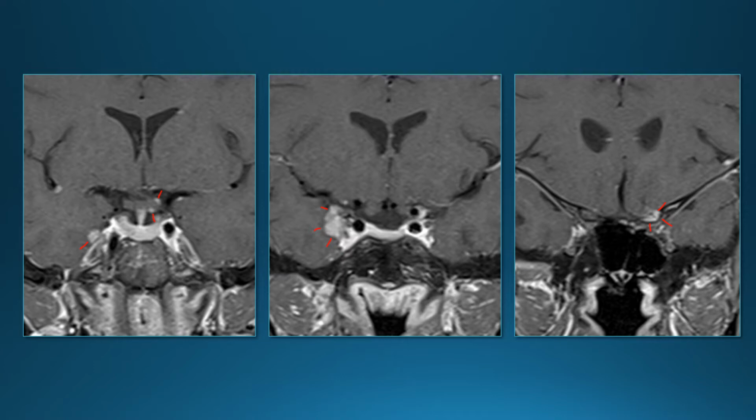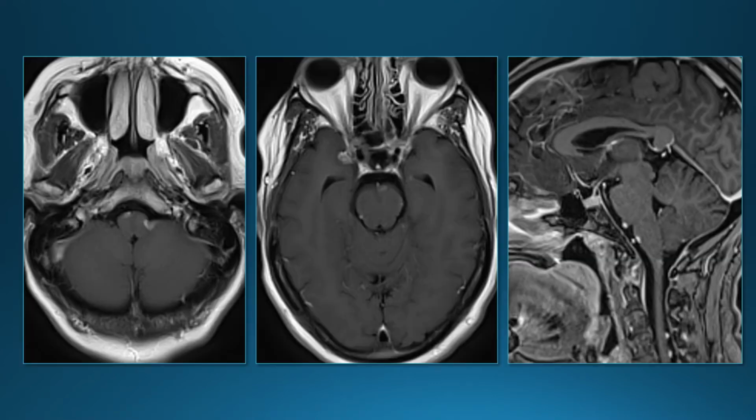So this patient has both pachymeningeal enhancement, this lesion along the cavernous sinus, as well as leptomeningeal enhancement along the optic chiasm and optic nerve. Some of the routine brain images show a little bit more leptomeningeal enhancement, a little focus here in the CP angle cistern, maybe a little bit here anterior to the brainstem. You can see over here on the sagittal, here's this pachymeningeal lesion, and here a couple of foci of leptomeningeal enhancement along the surface of the upper cervical spinal cord.